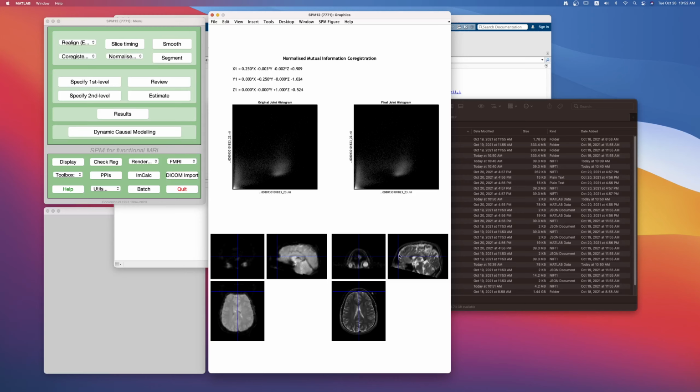I like to do clicking the front here first. And here, it's usually the case that in your EPI, you're going to get dropout in the front. So this is okay. You see that the border of the brain anatomically is here, but you don't see that in the EPI, all right? But you just want to check that it's not very, very badly behaved, all right? This is reasonable. The key, more informative parts will be at the back. So there's minimal distortion at the back. You see that they line up.